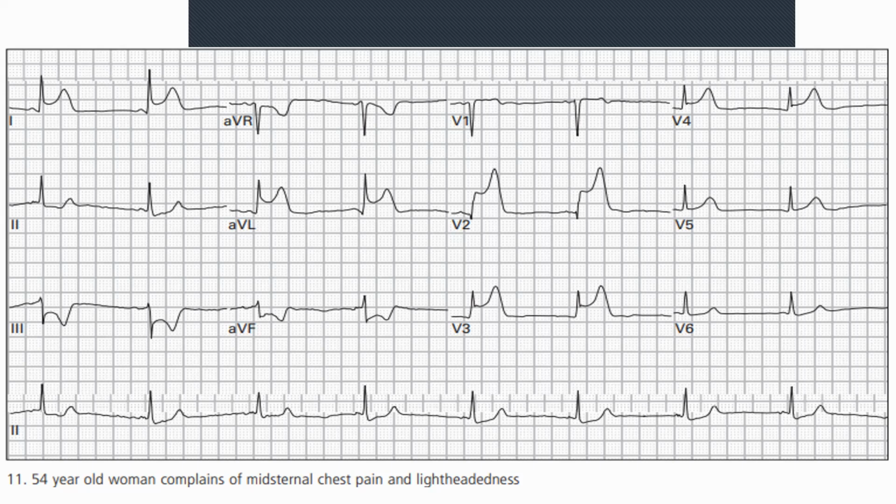So even before we look at the chest leads, we already know this is a myocardial infarct. Now the question is, how far has this infarct gone? Let's look at our septum, V1 and V2. What do you notice? Very good, ST elevations. Are these ST elevations low or high? Quite high. Even this one here too, you notice it's quite high. Let's look at the anterior of the heart, V3 and V4. What do we see? Very good, ST elevations.